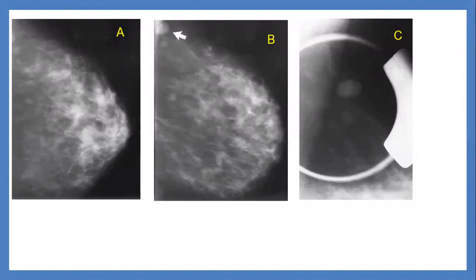So these are most likely intramammary lesions. Intramammary lymph nodes. Yes. Close to the vessels and cold. But is it typical intramammary lymph nodes? I cannot appreciate any fatty hilum. So these are atypical intramammary lymph nodes. These are pathological intramammary lymph nodes. But I don't know exactly if it is malignant or non-malignant, but they are pathological, atypical intramammary lymph nodes.